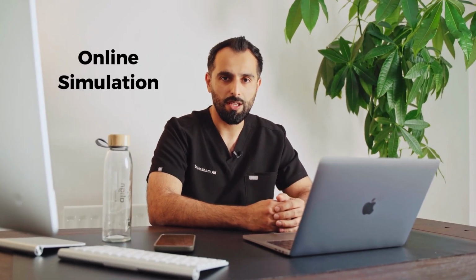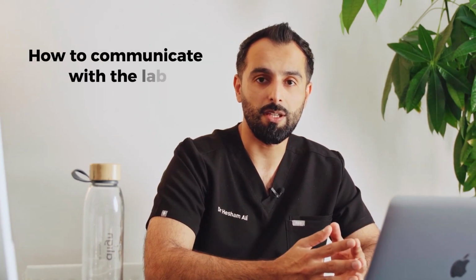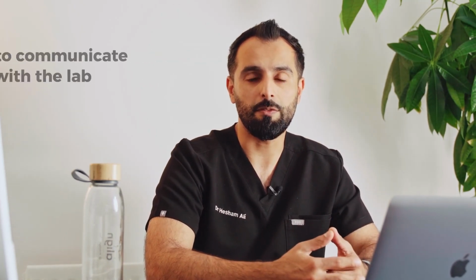Now, when you're providing aligner treatment, the key step is really the online simulation and how you modify this. Earlier on, I spent a lot of time and many hours were wasted in not understanding how to communicate with the lab that you're using, and therefore I was getting lots and lots of different plans back and spending a lot of hours and evenings in trying to get the right one for me.